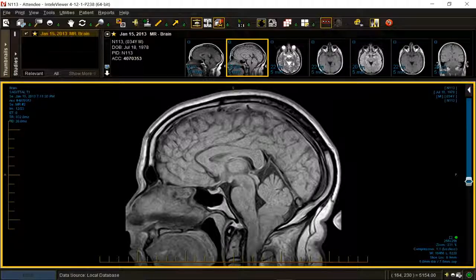So bone anomalies, syrinx, pointed tonsils, small occiput, crushed, squeezed, smallish looking from anterior to posterior cerebellum. That is when you should use the word Chiari 1 malformation, and only then.